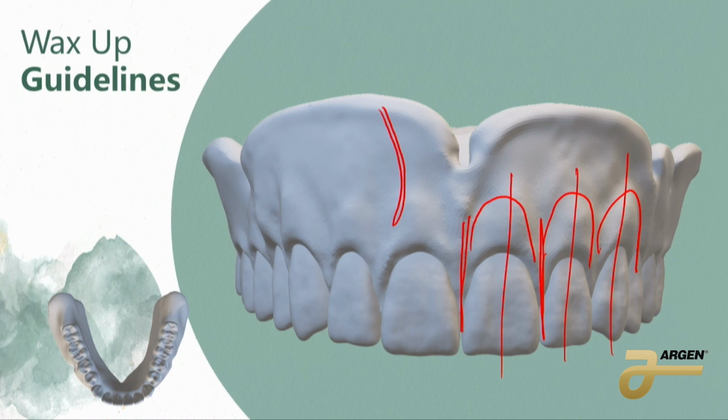And then I urge you to go look at how these highly characterized dentures look. Sometimes I think, myself included, we get a little overexcited and they're kind of beyond what a natural gingiva might look like, right? So we want these frenums cut here.